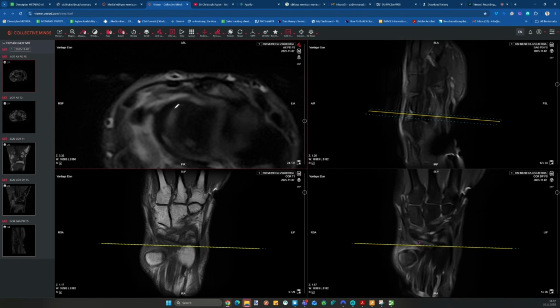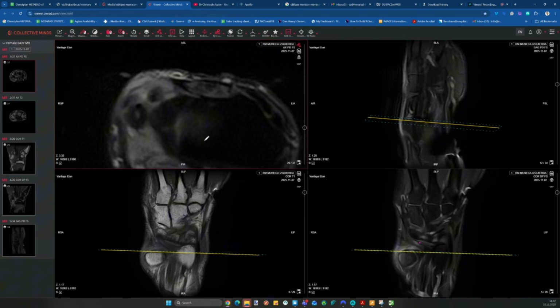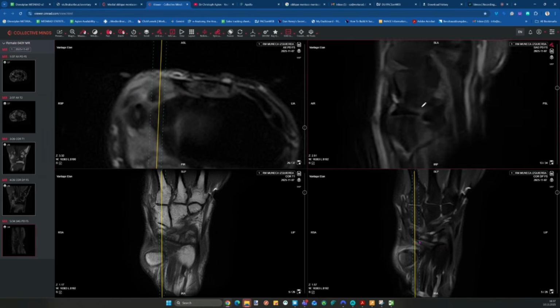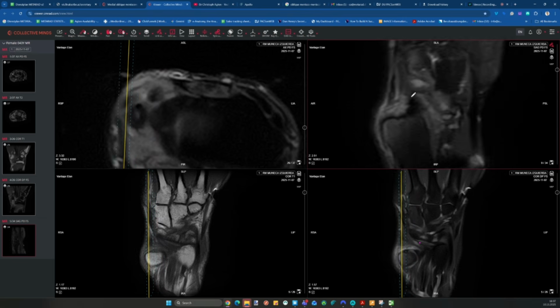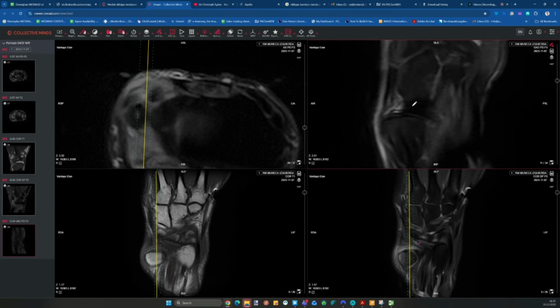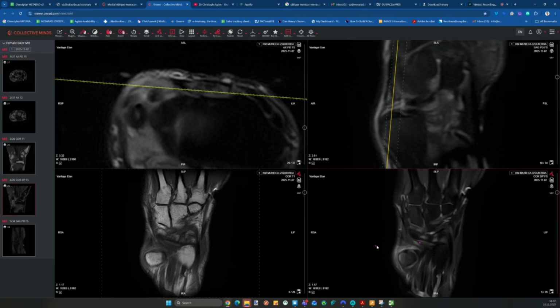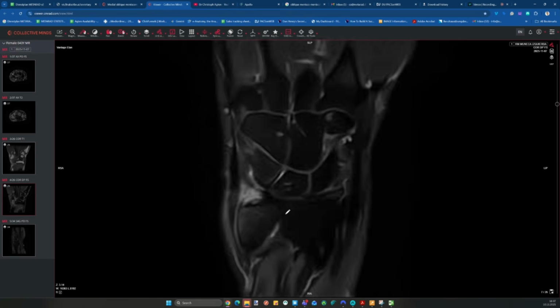So it's not torn. It's more like this perifocal tissue, the peripheral attachment of the TFCC ring that's involved. We can also see here, if we follow this, a nice sharp triangular meniscus-like structure, but then there is this edema here at the dorsum. And this one here is the styloid attachment, which is continuous. And then we have these fibers coming down into the foveal attachment. And I think also they, for me, would be intact.